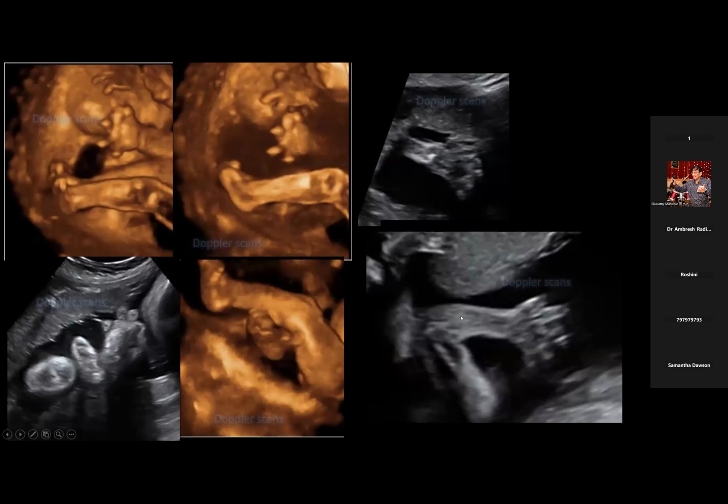So this is another case of abnormal number. Here you can see in this lower limb, there are only 3 digits seen. And the metacarpals and the phalanges are not ossified. You can see short, stubby, floppy fingers here, very short fingers and short toes here. In this 3D image also, it is well seen.